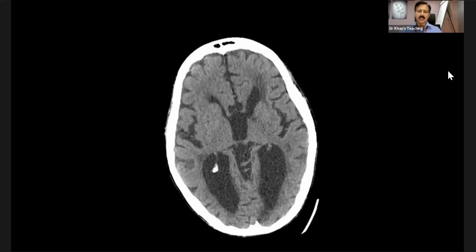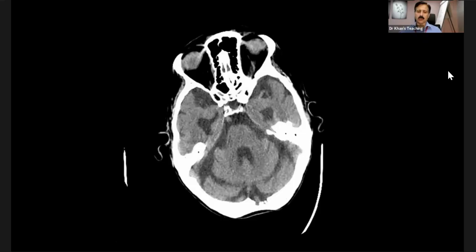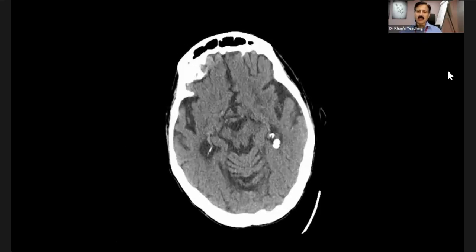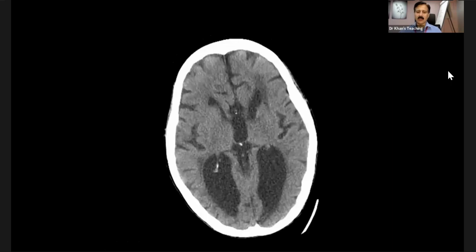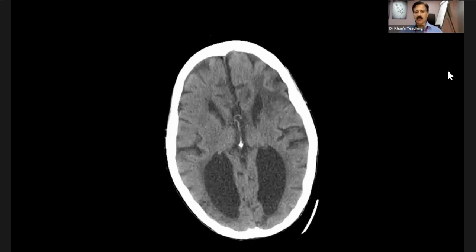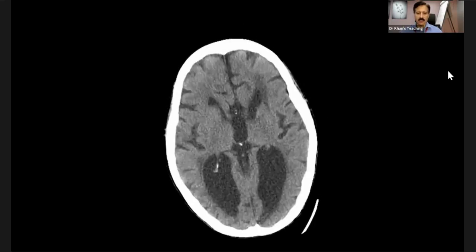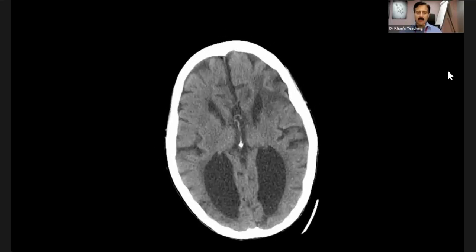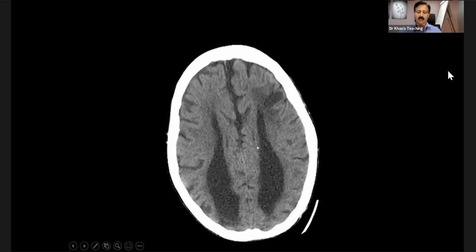And you see, this is the type of case which, if I had got it as an examiner, I would like to show you. Because this is a 73-year-old with corpus callosum agenesis, complete agenesis. The point is that I will open an axial slice and you will go up and down and say that there is atrophy, this is small vessel ischemia, and so on. But actually what is happening? Look at the ventricles, look at the space, and they are widely spaced. They are parallel. That's the key.